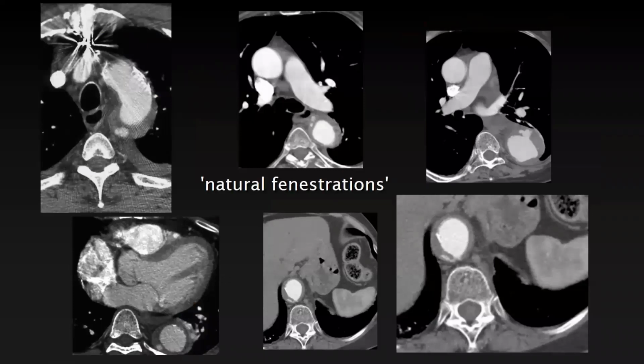Okay, so here are a couple of other examples. These are all from different patients, and they can come in all kinds of sizes and shapes. The communications are usually really small because, again, those are intercostal artery origins, where blood gets into this puddle in the IMH and then communicates to an intercostal artery or a bronchial artery, or it could also be an esophageal branch.